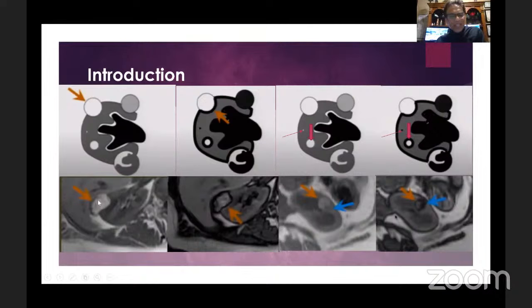You can also see that there is fat here, which is going to suppress on fat suppressed images. Another lesion, intraparenchymal angiomyolipoma, is going to show that India ink artifact all around it, as well as chemical shift artifact. Some of the lesions could be tiny, which will completely show dropout on out of phase imaging. If there are lesions containing less fat, then that portion of the lesion is going to show a drop on out of phase imaging.